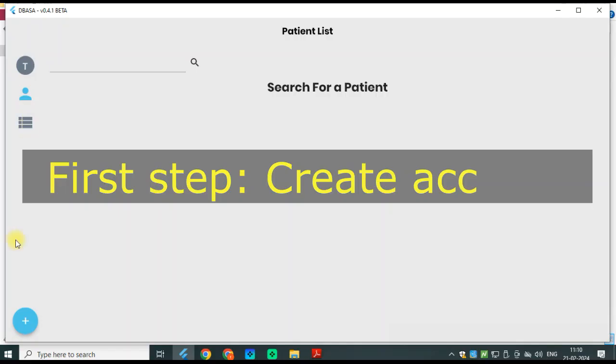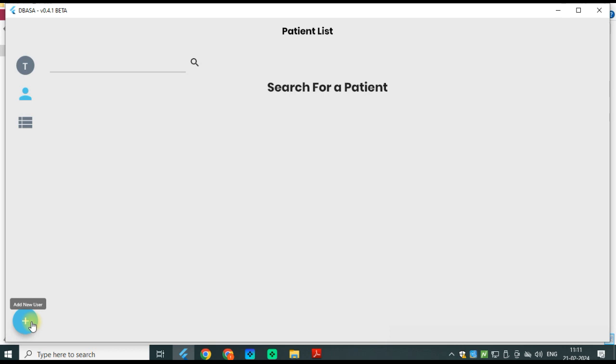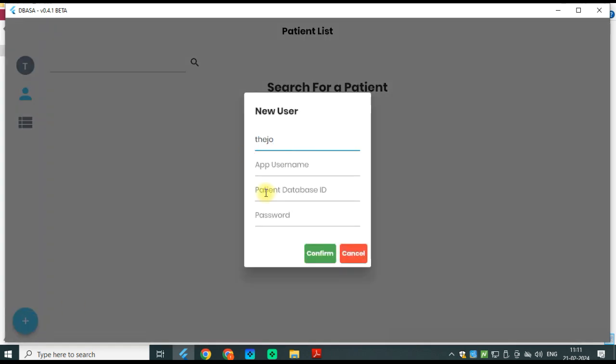The first step is to create an account. So you have to log into the Sudanta desktop application, open up new account details, and enter the proposed name, ID and other details. Once you enter, in this case we are setting it in my name, dummy PTK21, and I'm giving a password, ABCD, and after this we have to save it.